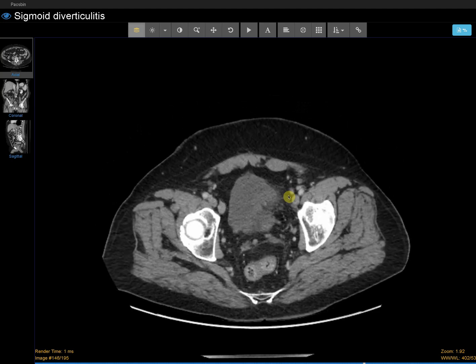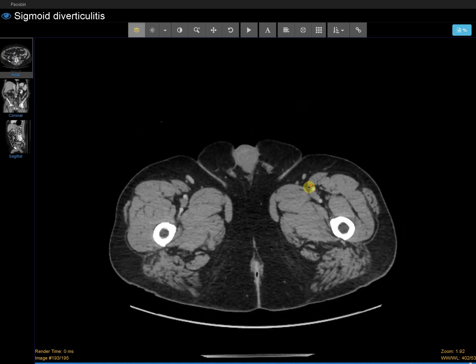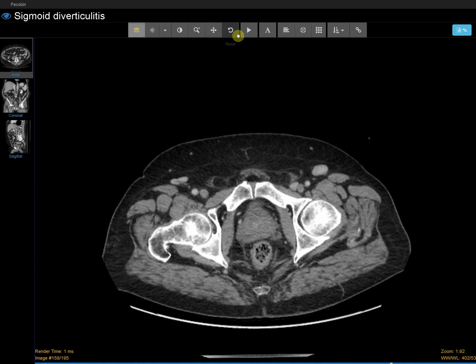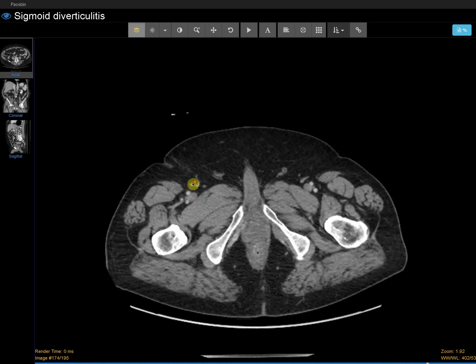There's a couple of lymph nodes here too. There's a few prominent ones, but again, even this seems pretty big, probably more than 1 centimeter in short axis. So let me try to measure it. How do I do that? Okay, I don't know how to measure it, but even something like this, I usually let it go.